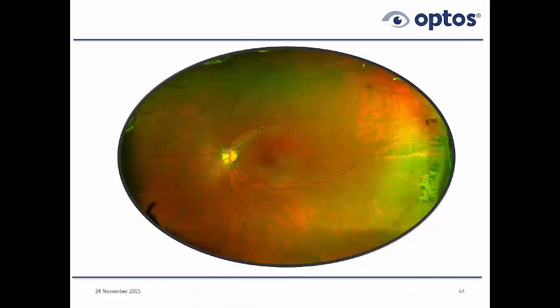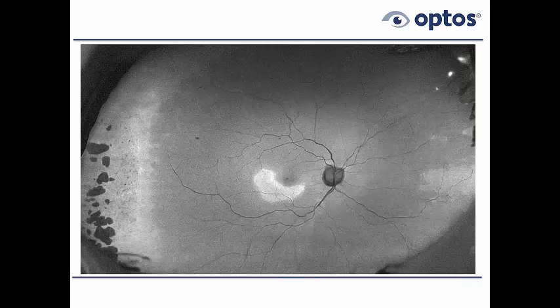Looks very symmetric. Looks like paving stone in the peripheral temporal retina. Disc looks okay. Macula looks okay. Not really much going on. So we can sort of say, okay, don't really know what's happening here. Well, since these are autofluorescent images with a Daytona, we can spend an extra minute or so and let's push the autofluorescent button and get another set of images. Here's her right eye, and here's her left eye.